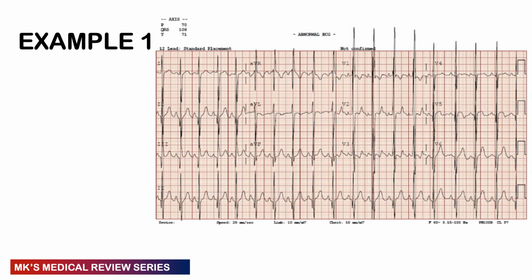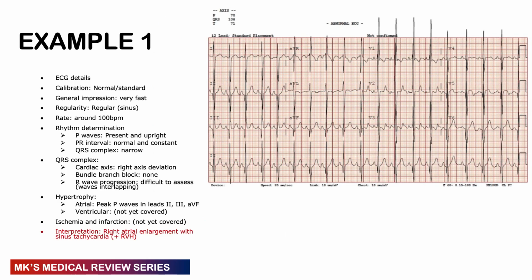So here's an example. Pause the video, write down your answer, use the 7 steps to see if you can work this particular example out. If you don't solve these things, you'll never understand them. And here comes the answer.